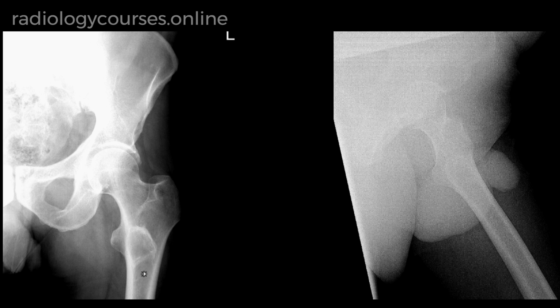Does this patient need further imaging? I would say no. I'm fairly confident that this is an incidentaloma and most likely to represent a non-ossifying fibroma. As the patient is asymptomatic, I would not recommend further imaging.